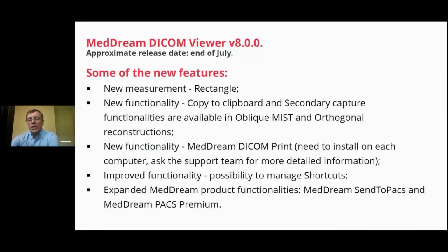Another very important feature, which is also very critical: for the last 3 months, I get requests each week from partners, please give users the possibility to customize shortcuts. For me it's the same. If I'm already used to some combinations like Control C, Control V, I expect other applications to support these combinations. If not, I expect to be able to configure. And thanks to our great development team, all our shortcuts since version 8 will be configurable, and will remain so in all next versions.